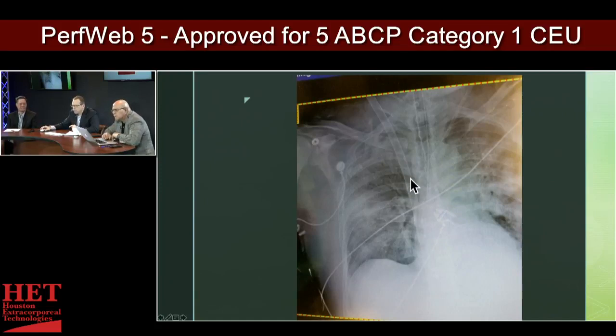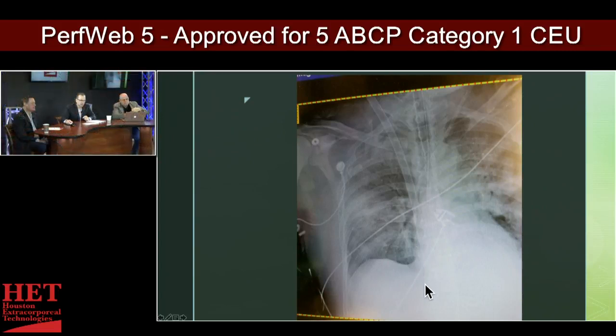The patient did not survive. And so you see the outline of the cannula coming down, and it's going into the IVC here. So generally, if it's going to go into the atrium and into the ventricle, that's going to happen up in this upper portion here.